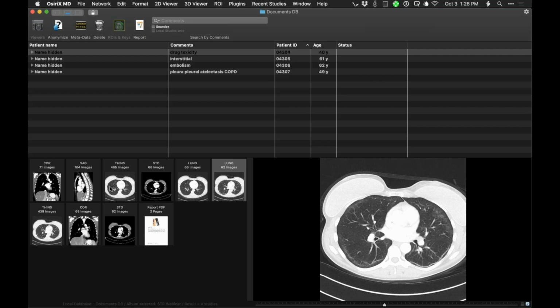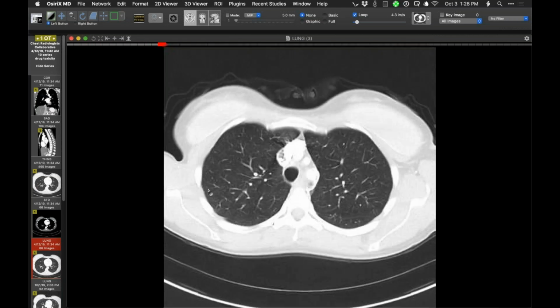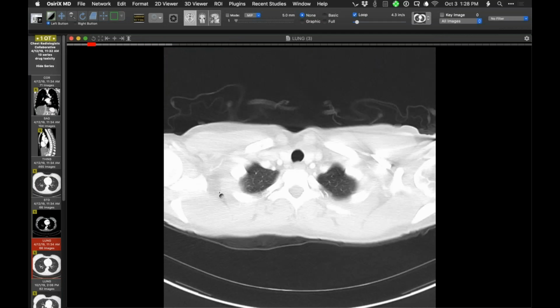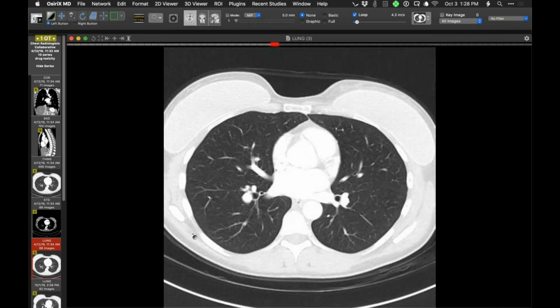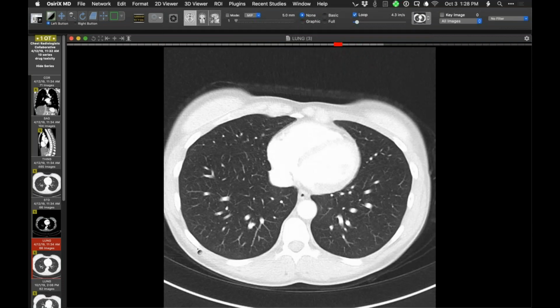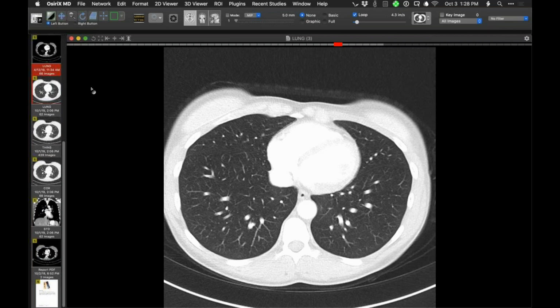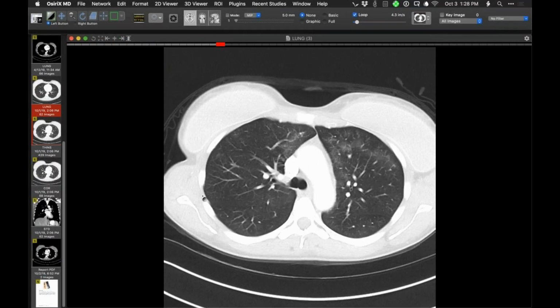And it turns out that, and I'll just show you a prior CT from April, her lungs look fine. We ascribe this opacity, by the way, probably to some regional radiation therapy. But when she came back to the clinic, she was indeed symptomatic. She did complain of respiratory symptoms, and I'll show you some more about that in a moment. So the context was treatment for melanoma and surveillance imaging. And of course, this is a surprise.